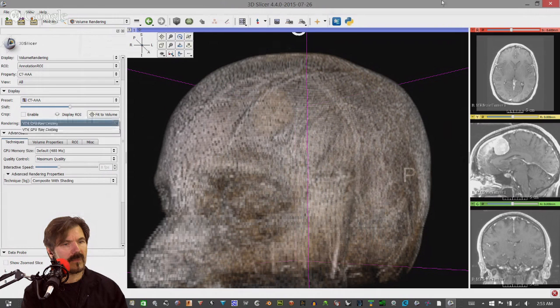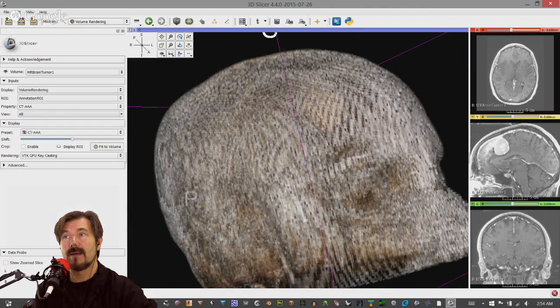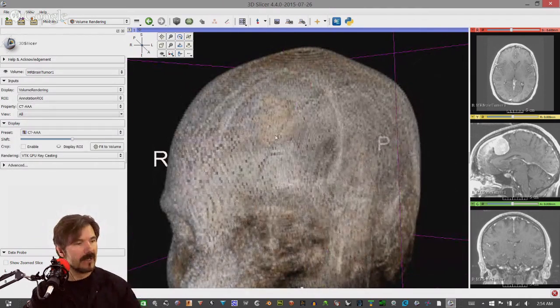I'll tell you, Mike, I'm having a good time. I'm using the Surface Pro 3 right now. It probably works really well, huh? Oh, it feels so good. I don't know if you see my hands going across the screen, but I'm just kind of maneuvering all the different slices with my fingers and using bits of that and the mouse, and it feels great as I'm just manipulating it. Actually, I've got a touch screen on this particular laptop too, and I can do it.